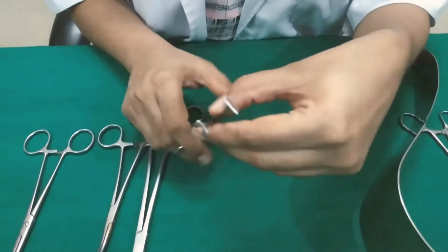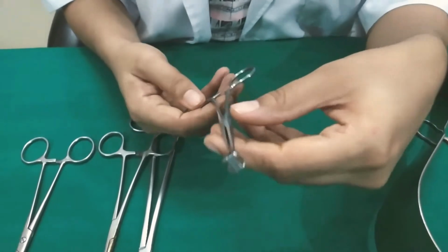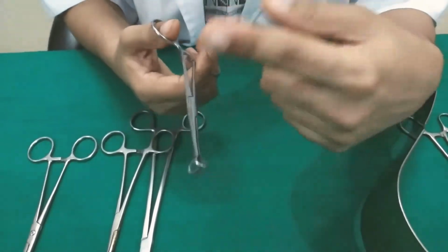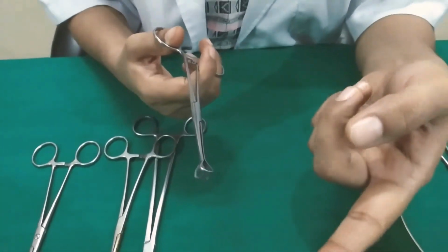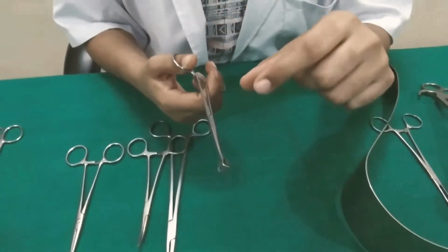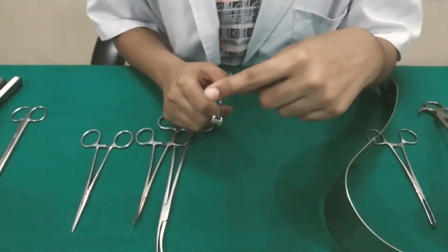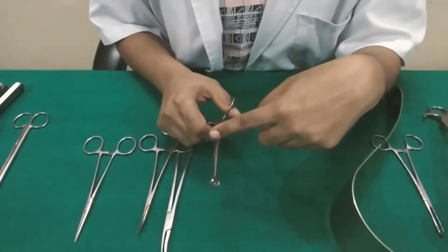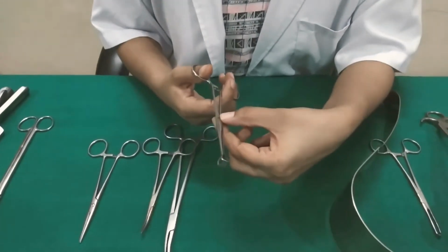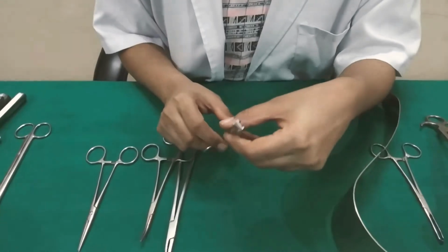So students are supposed to know the various methods of ligation. A secondary use is tuboplasty, that is recanalization, to hold the tube. It is also used to hold the ovary during ovarian cystectomy, and it also holds the ureter during Wertheim surgery to dissect it, and it can also hold the bladder wall during repair of the bladder.